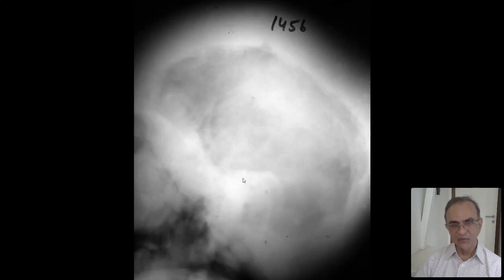In osteopetrosis, you see skull base affection. You do not see so much affection of the skull wall. Now look at the thickness of the skull wall here. It's 1.5 centimeter. That's not something that happens in osteopetrosis. You saw the examples of osteopetrosis that I showed you. This one is very different in terms of the width of the skull wall. And so if you are shown just one X-ray, you call it craniodiaphyseal dysplasia, diagnostic, no differential diagnosis.